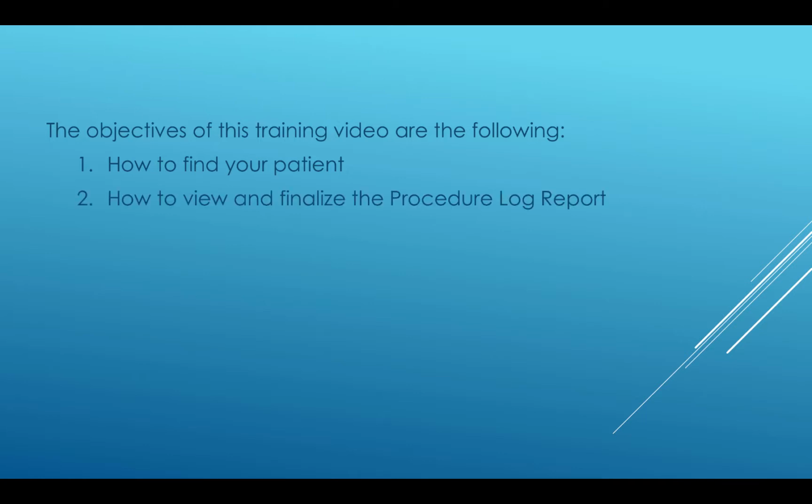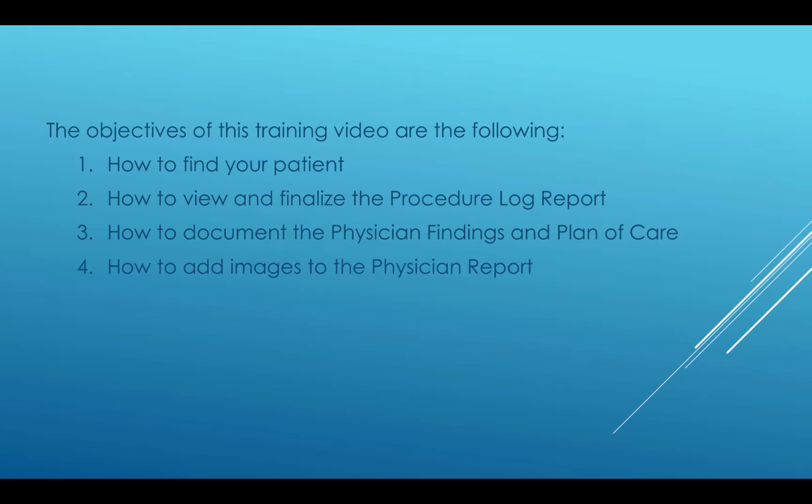The objectives of this training video are the following. 1. How to find your patient. 2. How to view and finalize the procedure log report. 3. How to document the physician findings and plan of care. 4. How to add images to the physician report. 5. How to view and finalize the physician structured report.